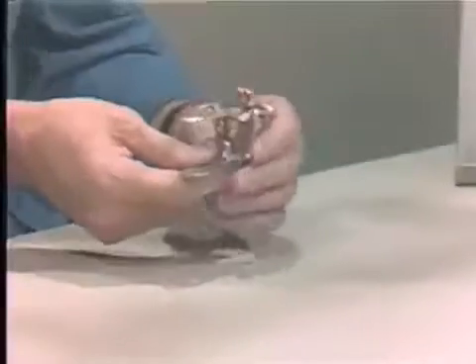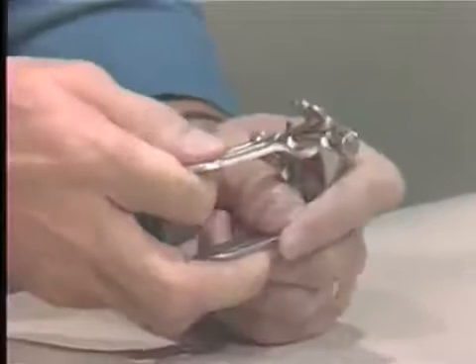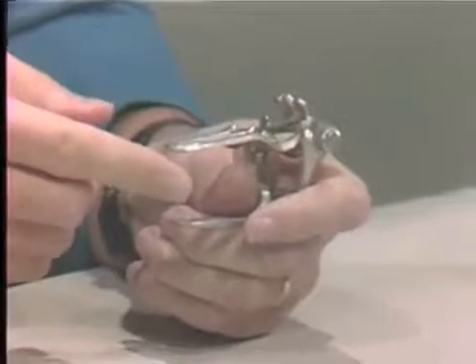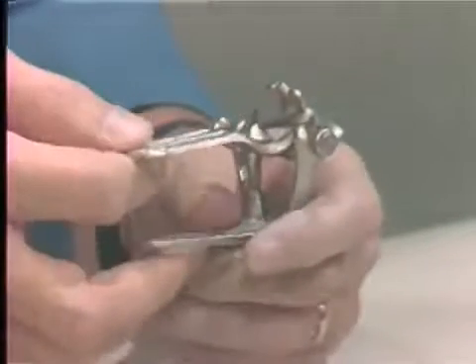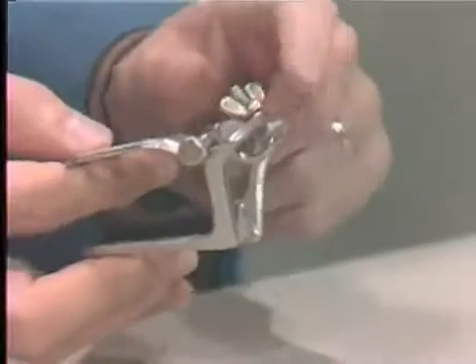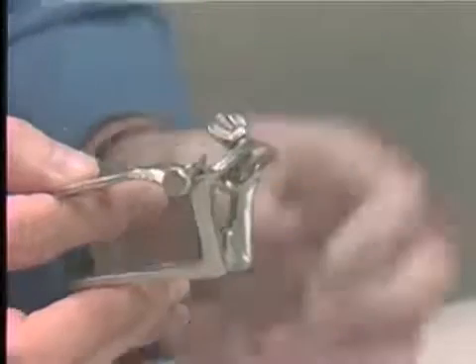Now the next one is a slight improvement over this, but basically the same thing, but it does have some slight compensation for lateral movement, as you can see. But this is determined either by the guidance of the teeth or by the fixed pattern that the articulator has built into it. You can also control the closure slightly by the screw in the back, so you can regulate that.